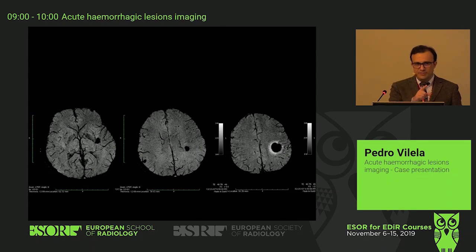Could be. That is good. Could be thyroid cancer full of metastases. Although it was actually strange that this one and this one had no edema. But the symptomatic one had. The edema just tells us, in this particular disease, that the lesion has changed in size. And the change in size had associated with edema. But it has many other dots.